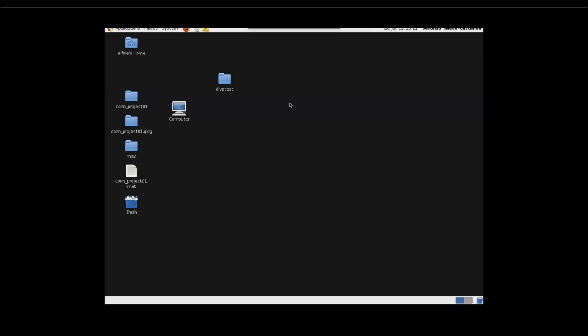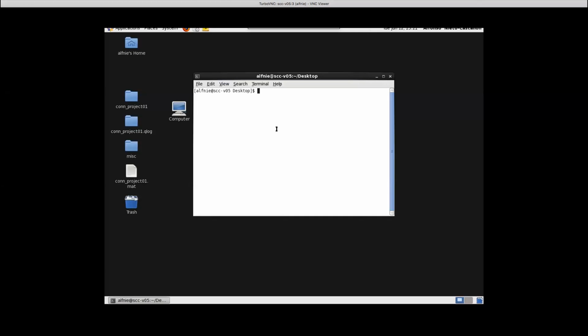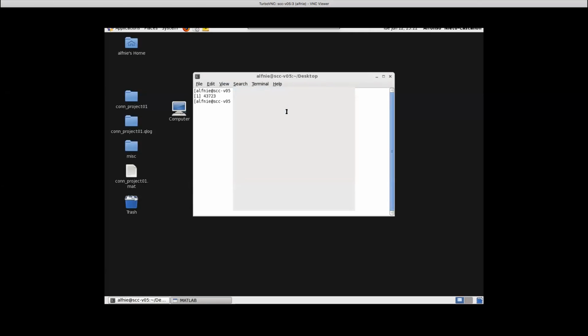So derivatives is everything created by the pipeline, and MNI space is because I ran the MNI space pipeline, and then it runs by subject, and then it goes to results. When you import data, it goes into the sub-something folders.